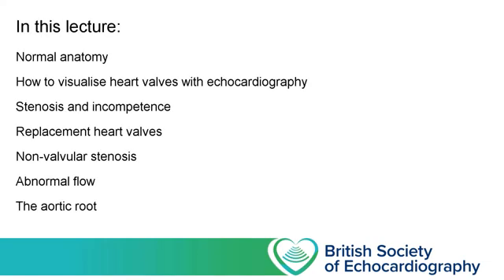In the last lecture we looked at colour Doppler and how to use this tool, and now we're going to consider some practical applications of this and how we can use the combination of colour and 2D imaging in order to have a look at the heart valves. There's lots to pack into this lecture.